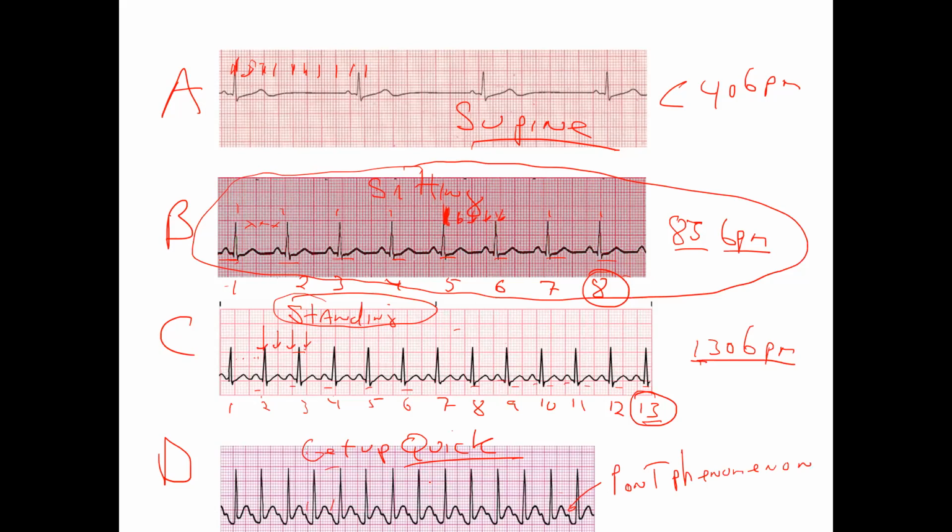Can it change when she exercises? Yes, that's why we do exercise stress tests. So we have to be careful. We have to look at all 12 leads, make sure all parts of the heart are okay. But we know she's good. We're just looking for heart rate here. And we already kind of know the rhythm.